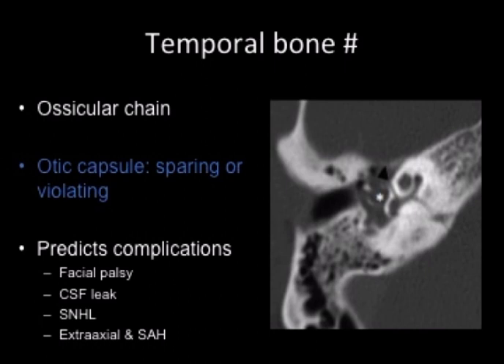So in this case, there is soft tissue in the middle ear. There's a fracture through the anterior wall of the mesotympanum. The fracture line extends posteriorly into the otic capsule. So the otic capsule is bone surrounding the labyrinth, and it's the densest bone in the body. Makes fractures a bit easier to see. And of course, it protects the bony labyrinth so you don't become dizzy.